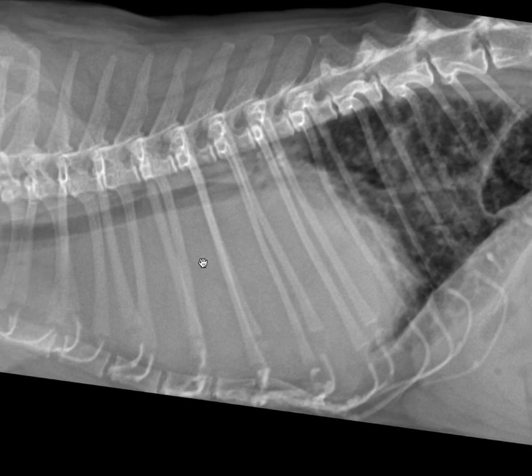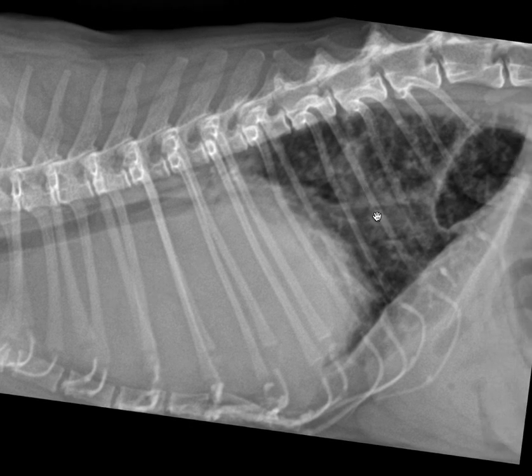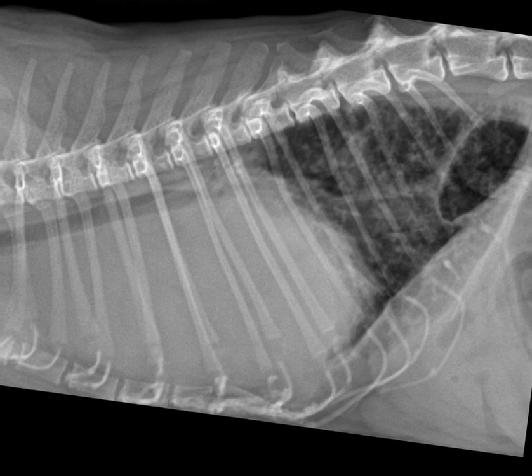So, putting it all together, we suspect a large craniomediastinal mass effect. I would be quite certain that there's also some pleural fluid here that's contributing to this border effacement. You could correlate that with a TFAST to confirm pleural fluid and enable sampling. You could also correlate with palpation to sort of see the chest compliance in the craniomediastinum, and often we can do intercostal sampling of the thymic mass if it's considered safe. The bronchial lung pattern may be related or may be entirely unrelated.